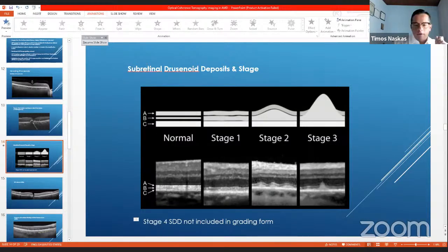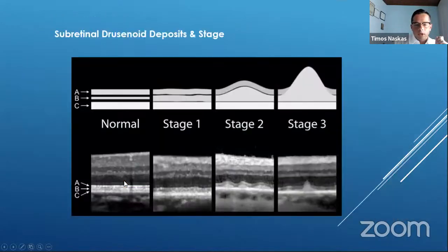But whenever you go to the actual OCT, you see that the interdigitation zone is not as straight as in the graph. So this is normal, but this can be easily misunderstood. So to go back to the question, let me check the question. Yes. So there were several features that the OCT did pick up, but the fundus photography failed to do so.